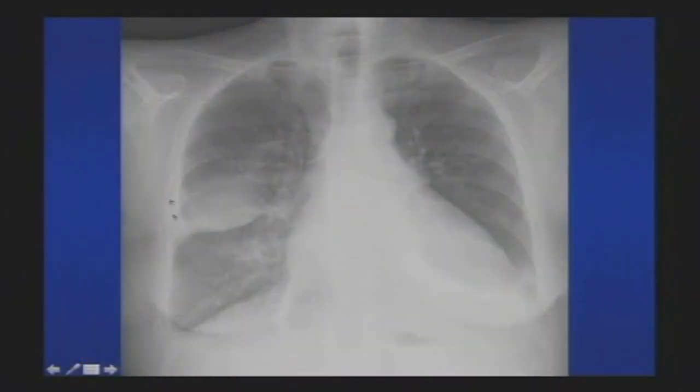Okay, here's a mass. How do I know that this is not in the lung, even though it projects dead center in the middle of the lung? Well, the superior border is very, very indistinct. If this was a nice round lung cancer, you would expect it to be very well defined all the way around. So even though it's projecting in the middle, this is a pleural lesion.